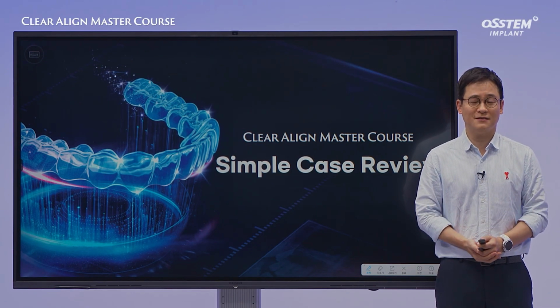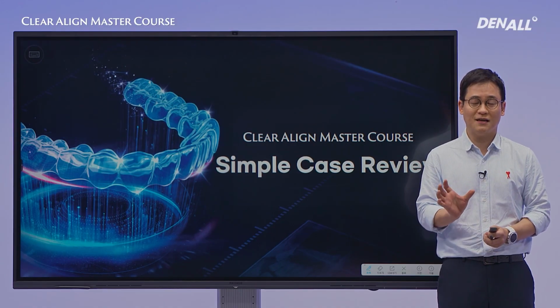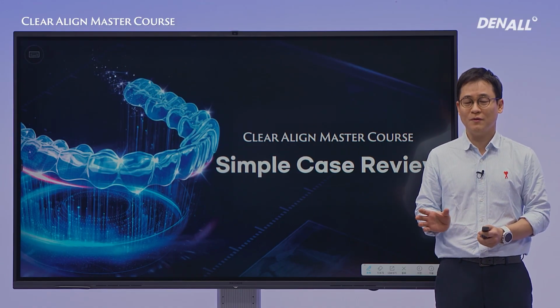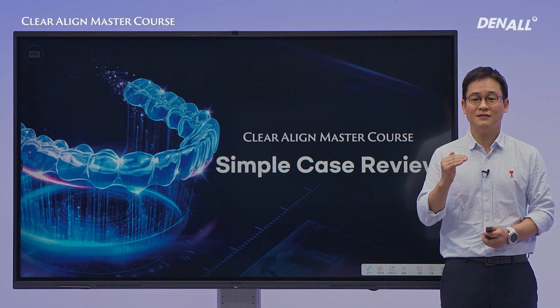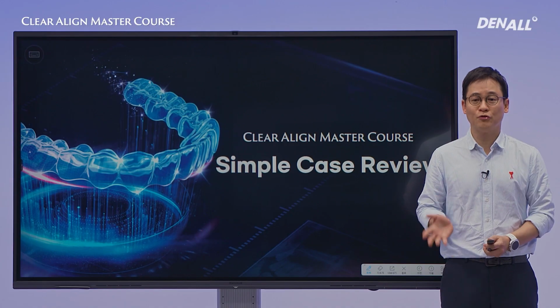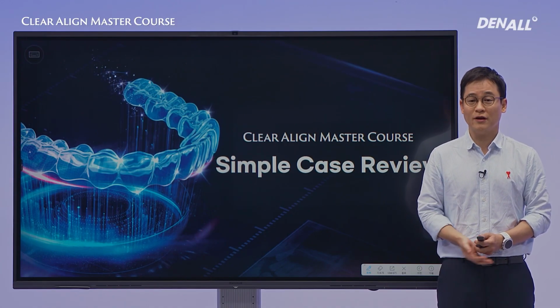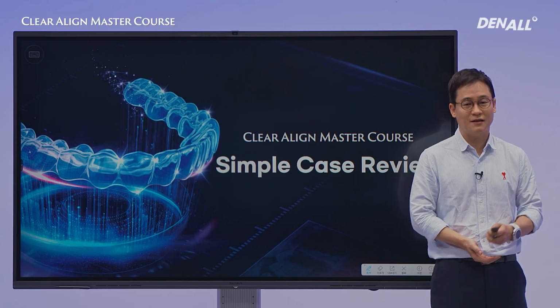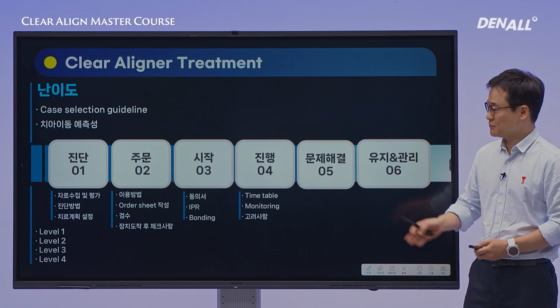The title says simple case, but that doesn't necessarily mean it's truly simple. Depending on whether molar movement or distalization is required, cases can be categorized as either complex or simple. Today's case is about successfully addressing the patient's chief complaint without molar distalization. So this is the part I emphasize at the beginning of the course.